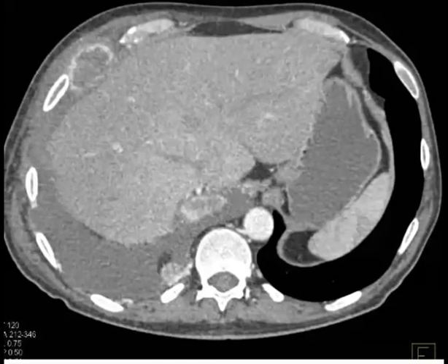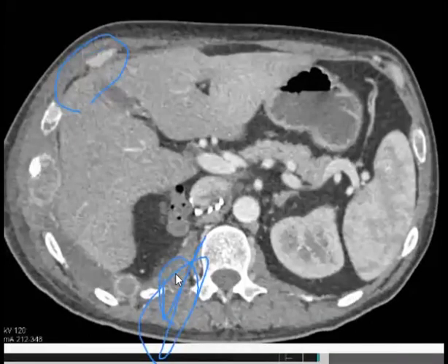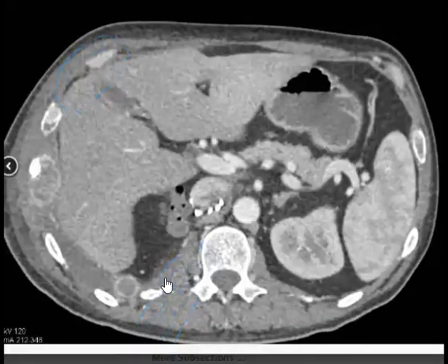I think you can describe this lesion, which is in the perihepatic region. A pleural-based lesion and pleural effusion, or ascites, sorry, both pleural effusion and ascites. And there is soft tissue thickening here on the pleural side. Again, peritoneal nodules.